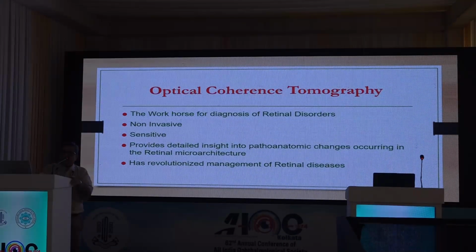So ladies and gentlemen, I've taken a lot of time, but basically OCT is the workhorse for retinal disorders. Diagnosis, management, follow-up. It's non-invasive, sensitive, and provides a detailed insight into the pathoanatomic changes that occur in the retinal microarchitecture and has revolutionized the management of retinal disorders.